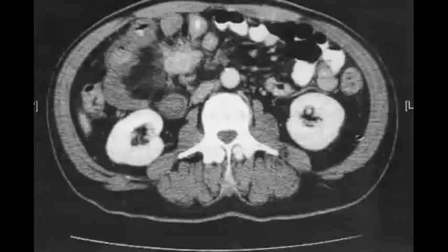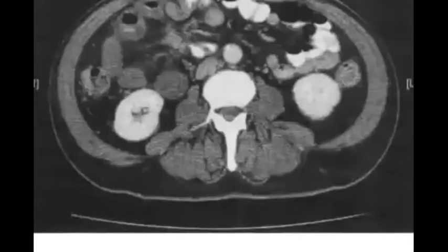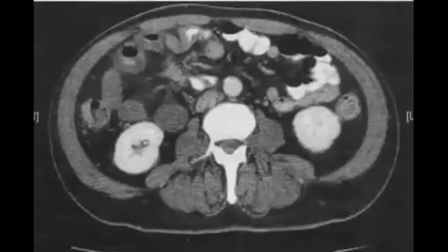So something nice to know, as you see, mesenteric mass with desmoplastic reaction, mets, sclerosing. So I see that everyone agrees that it could be this carcinoid. Maybe we just mention that it is in the location in the right upper quadrant, with stellate appearance to the surrounding fat, so it is important in description. And I am looking for, yes, Marwa, she mentioned the bowel thickening. So you should comment on the bowel thickening, yes, for the exam and for the practice, whether there is any affection in the bowel or not. So you will take marks for this or not.